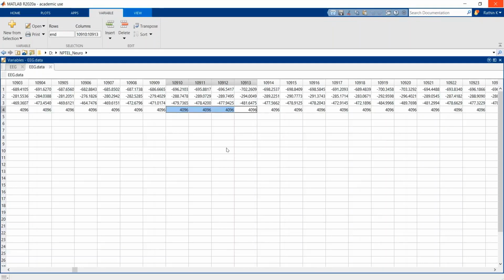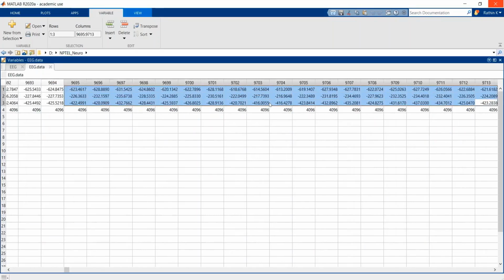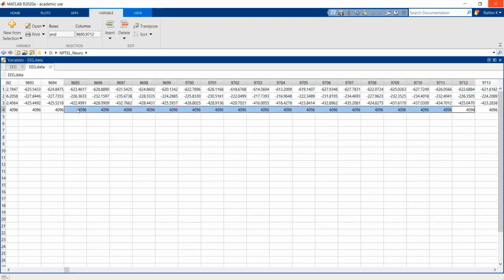In other words, one particular bit out of the bit stream is changed from 0 to 1. So you can see that an event is generated, and I want you to realize that these three rows are your biopotential, analog in nature. At the same time, this last row is your event data, which has been stored.